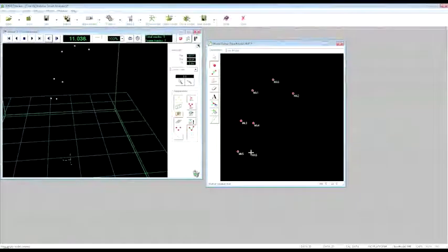Remember that, in general, the position of the markers here is not important, because this is just a drawing. But it is important to position them in order to remind us in the future which bony landmark points we have used. If you prefer, you can also select this tool and move the position of the markers.